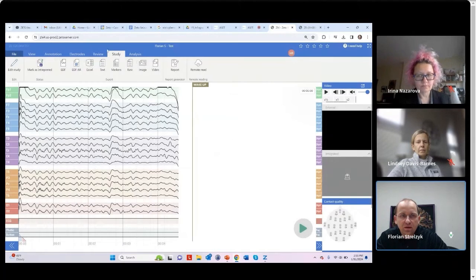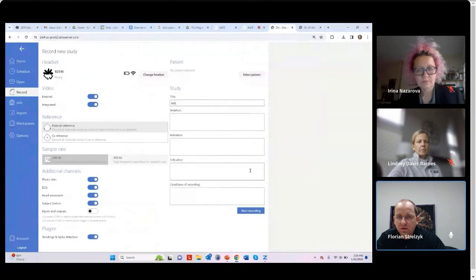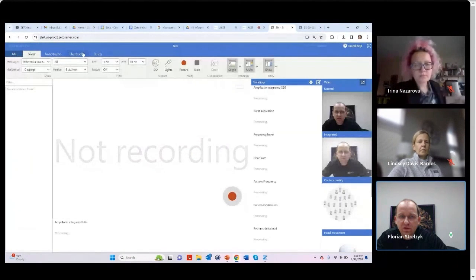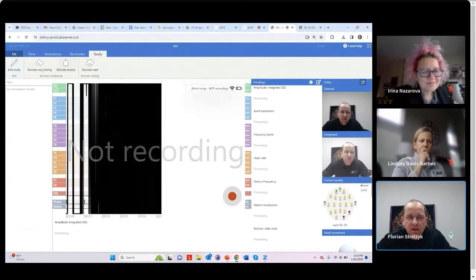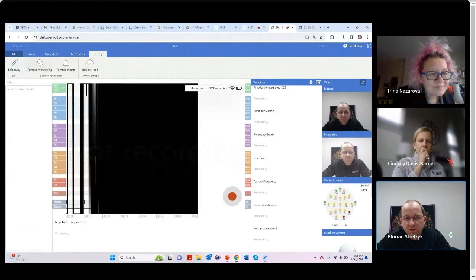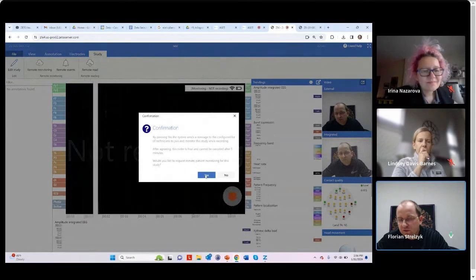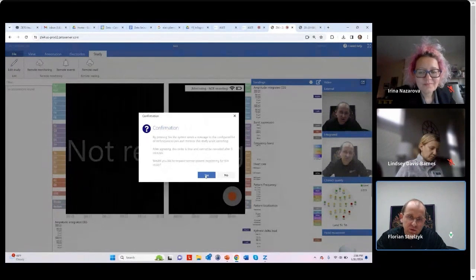In the real-time mode, when we start recording here, let's just have another test data set real quick. You can also order a real-time monitoring. Let's see here. You can now also request a real-time monitoring service. Now, real-time monitoring, those are not physicians. Those would be registered EEG techs coming online within 30 minutes.